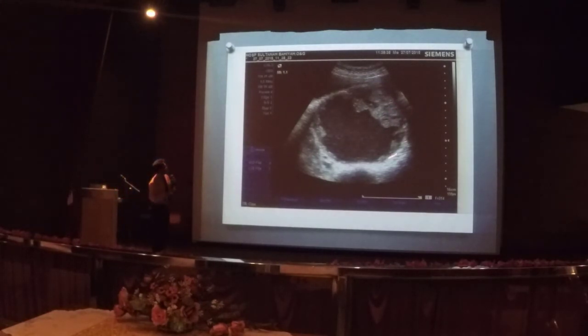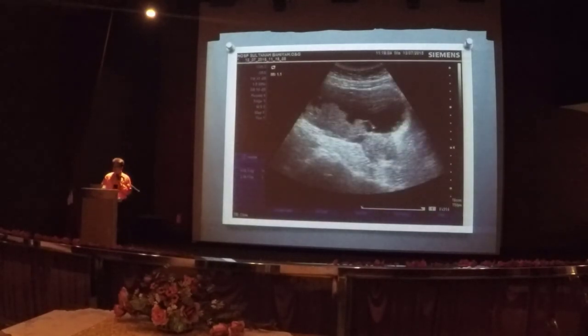You have a solid cystic tumor, solid areas, cystic areas, a lot of papillary projections at the base. That is another example of a not good looking picture that you do not want to see. That indicates you need to refer urgently. So this is another example.